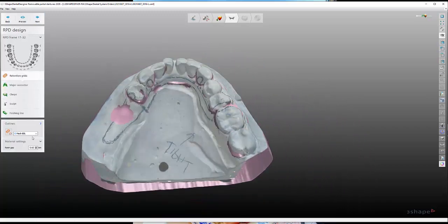Next. So we have a lot of the DME library here, and everything will end with the part dash BDL. 95% of the cases we use this pattern here, this very first one, the mesh dash BDL. It's just a simple circle.